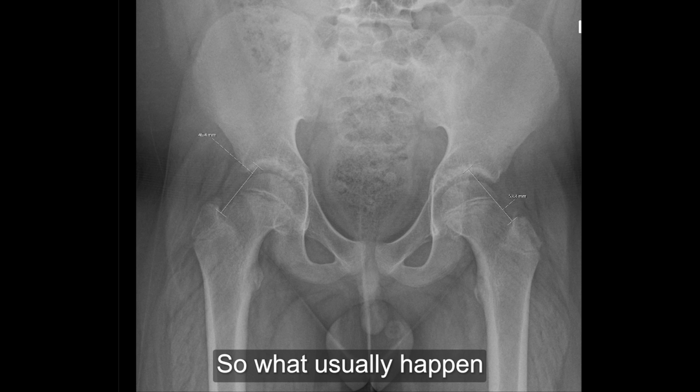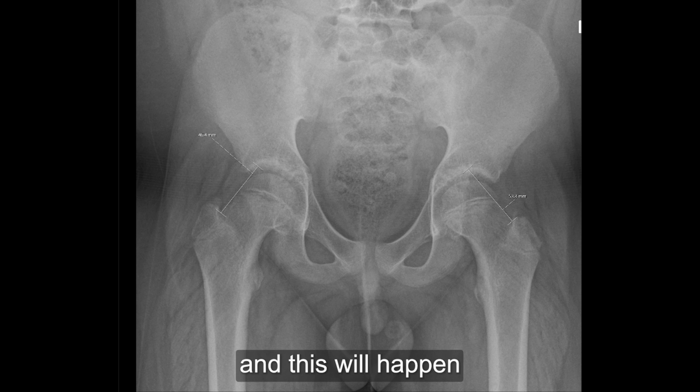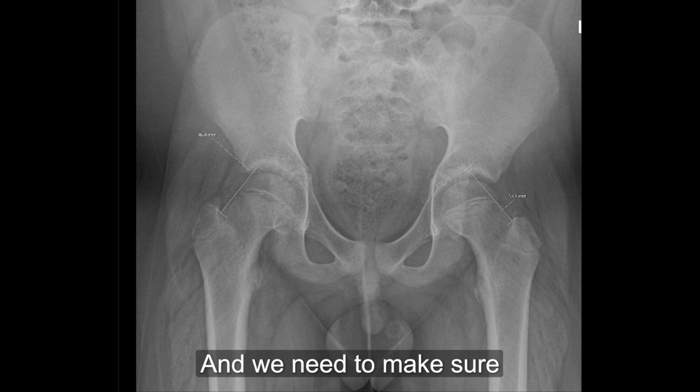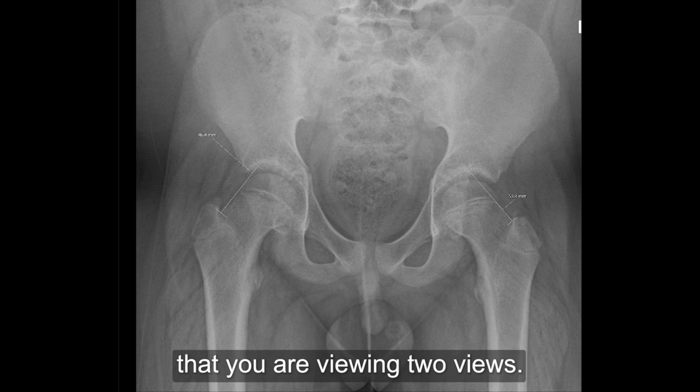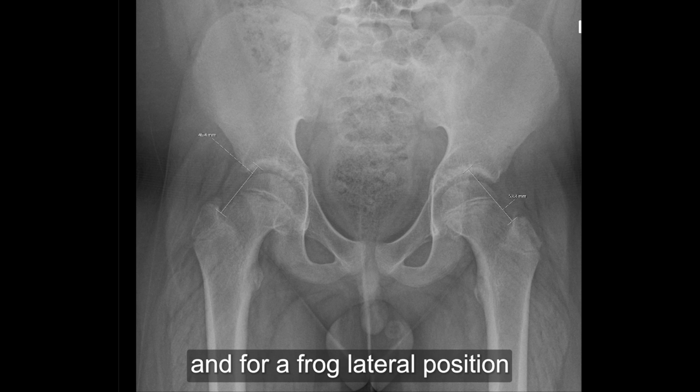So what usually happens is that with repetitive trauma, especially in obese children, you will see a widening of the physis, and this will happen usually during the growth period, and that's why we say it happens in adolescence. And you need to make sure that you are viewing two views. One view is too few, so you need to have an AP and frog lateral position before you can exclude a case of slipped femoral epiphysis. And if you're not sure, always ask for an MRI.